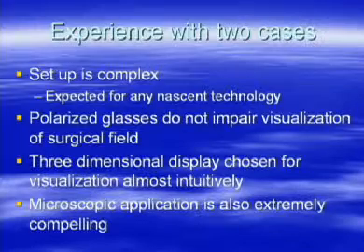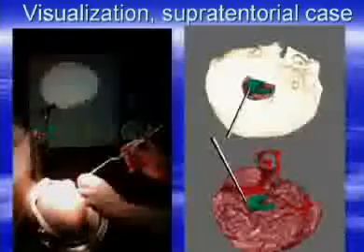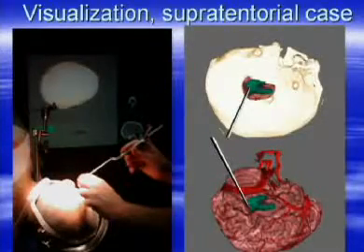It was really a compelling display that literally leapt off the projection system in the operating room and really gave you a very firm sense of exactly where you were located at all times. Of interest, the microscopic application, the stereoscopic depiction of location, was also quite compelling. Now, this is the view that you would get in this situation.